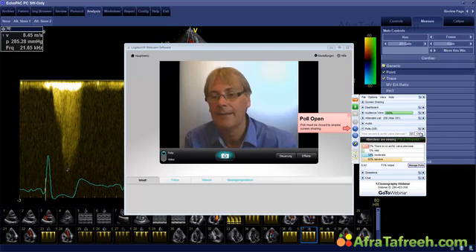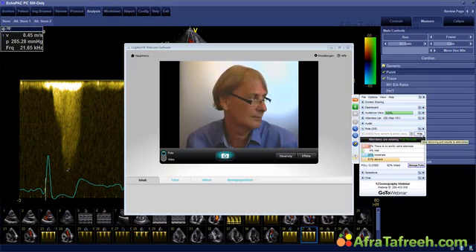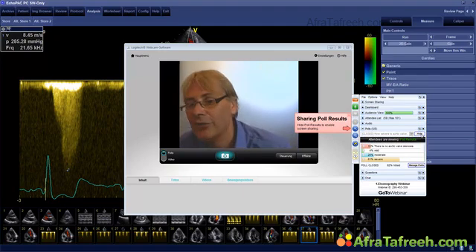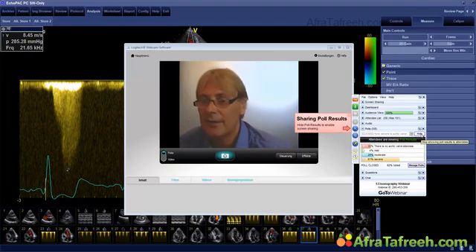Okay, 70% have voted. Who says there is no aortic valve stenosis? Five say it's mild, moderate, severe. Okay, I'll close. So here are the results. Most of you said it's severe. So it's severe aortic valve stenosis.